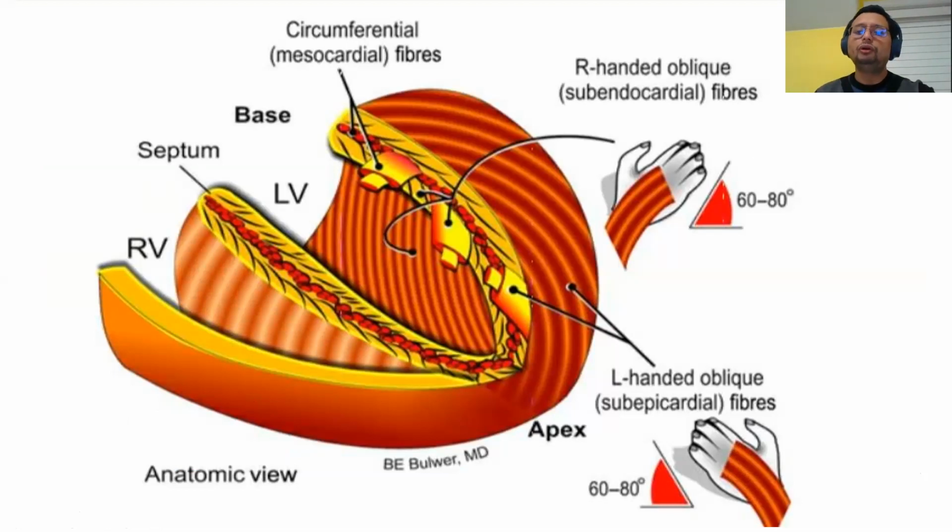Okay, so therefore, most of our measurement of function of the right ventricle is a measurement of longitudinal function, such as our S prime, which is the tissue velocity, such as our TAPSE, and TAPSE is one of the most reproducible measures of right ventricular function. For those of you who are interested in advanced echocardiography, for example, when we want to do strain from speckle tracking, when we do right ventricle strain, we mainly do longitudinal strain.